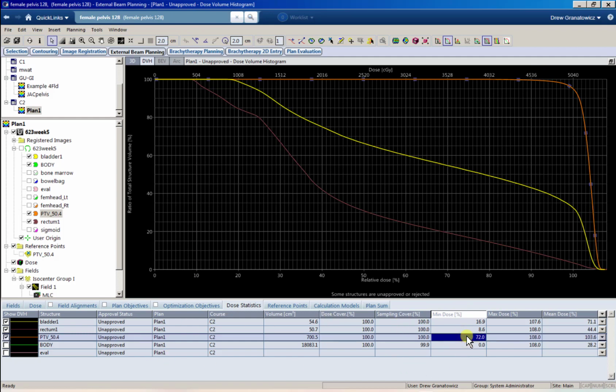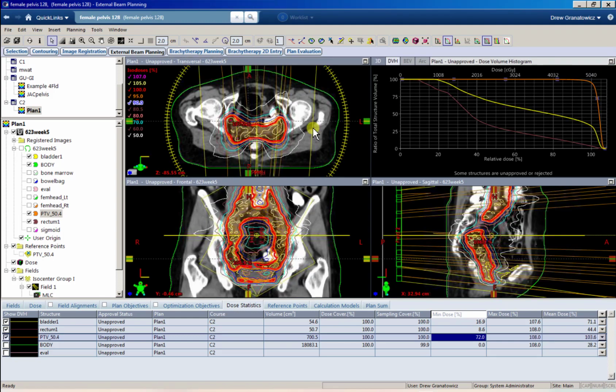Usually, if I'm not given a min dose on my PTV, I'm going to allow that as long as I keep really good coverage on my CTVs and GTVs, okay? So you want the min dose on your CTVs and GTVs probably to be a little bit higher, but in my opinion, most of the doctors will accept a little bit colder min dose on your PTV in order to meet OAR constraints, as long as your CTV and GTV are okay. But it's not always the case. Sometimes you need that good min dose on your PTV, like from last week from the lung case, for example. Okay.